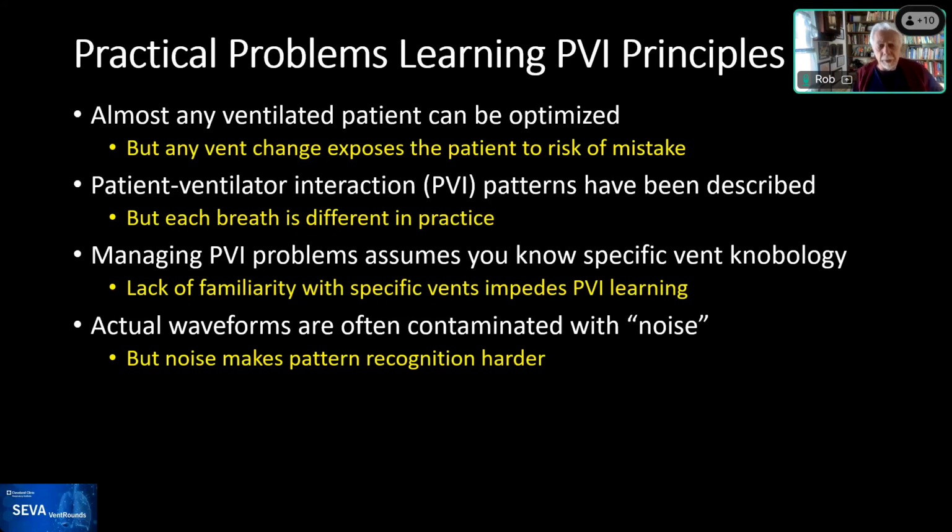Now, managing problems that you identify assumes that you know specific ventilator knobology, but lack of familiarity with a specific ventilator, if you're actually putting your hands on a machine and looking at the waveforms, can impede your learning of these PVI waveforms. So again, if you have a simulator, it's generally a generic type of ventilator, simple modes, and simple controls that everybody is familiar with.